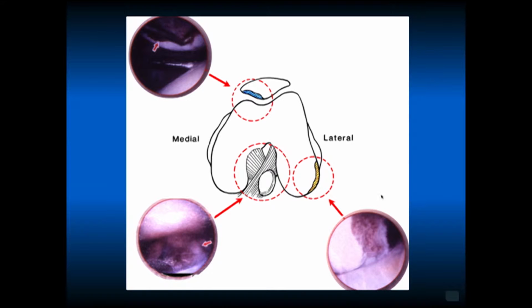So what happens with this mechanism? If this is medial, this is lateral. The patella piece comes off when the patella either dislocates or relocates. This shows where that loose body was lodged, and sometimes there can be injury to the lateral aspect. Usually it's the non-articulating part of the lateral femoral condyle, so this is an impaction shear injury where there's another loose body that came off when the patella was lodged there, and this is what that piece looks like. It had actually floated to be in front of the anterior cruciate ligament. So this is where the piece was that got knocked off from the medial aspect of the patella.